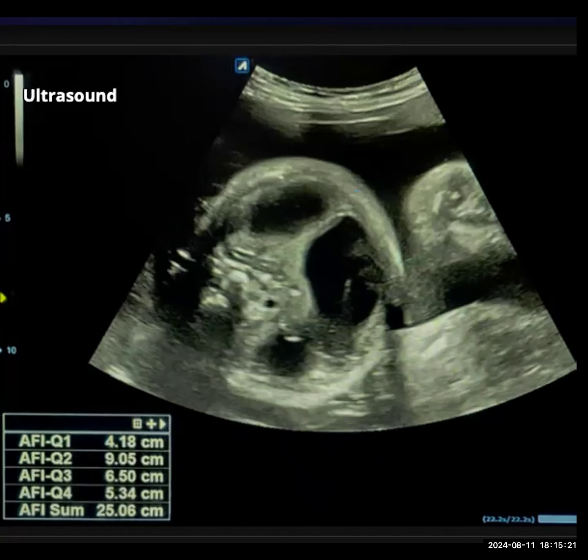If the patient is already delivered, I would like to reassess the X-ray images of that patient to see what the abnormality is, because the patient is not passing meconium. And I would also like to image the abdominal sections with cross-sectional imaging such as MRI for further characterization. Thank you. This is your next case.